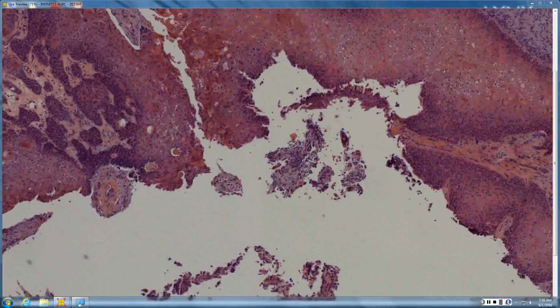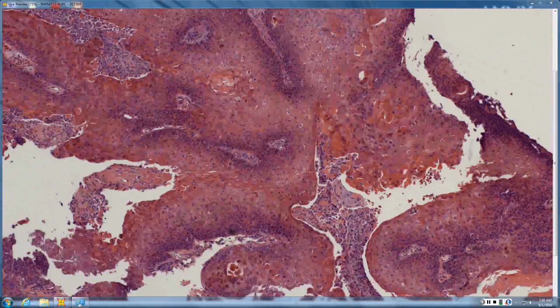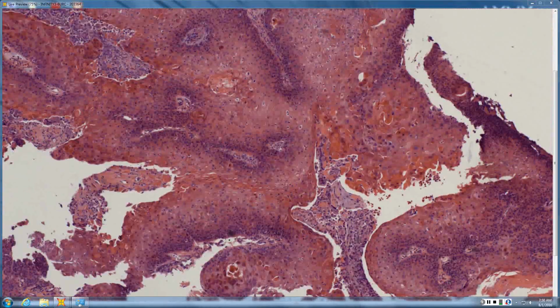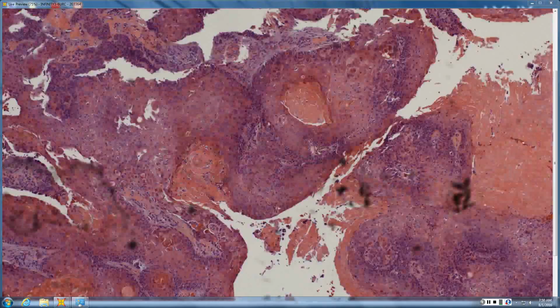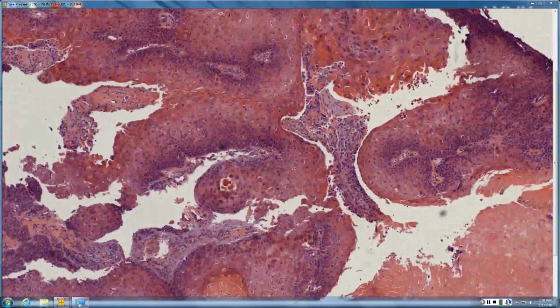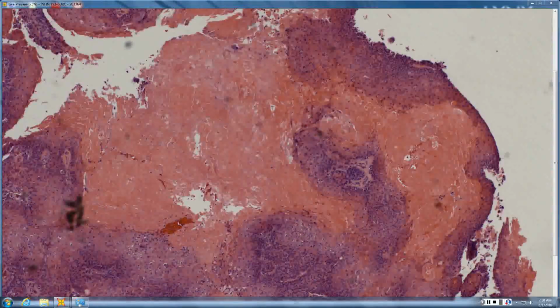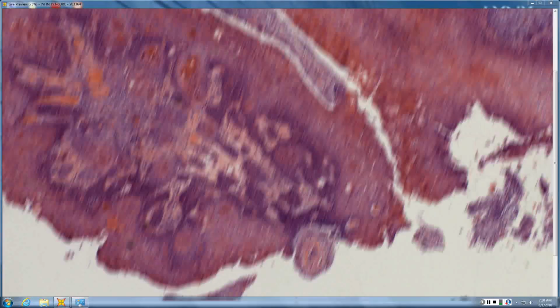So let's see, you want to call for a lifeline. Rob, you want to jump in and help? I was kind of thinking verrucous carcinoma myself. I guess a warty dyskeratoma would be in there. For warty dyskeratoma, you'd look for acantholytic dyskeratosis, clefting, which we don't see a lot of. Anyone else want to jump in? Squamous. So proliferating pilar cyst, or proliferating tricholemmal cyst, is a big look-alike for squamous cell carcinoma and often gets miscalled that.